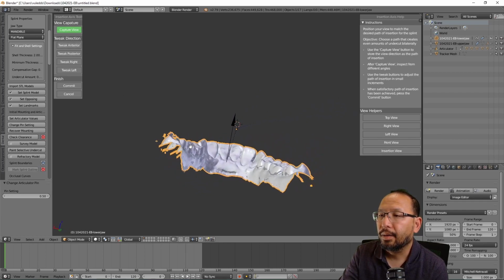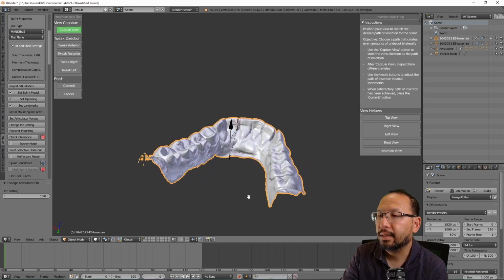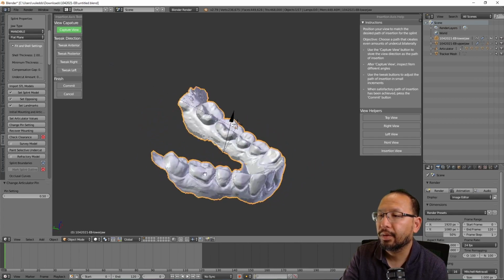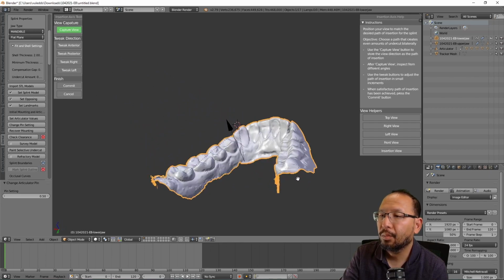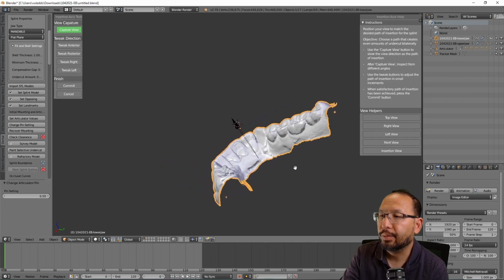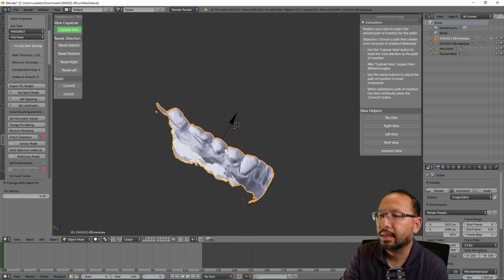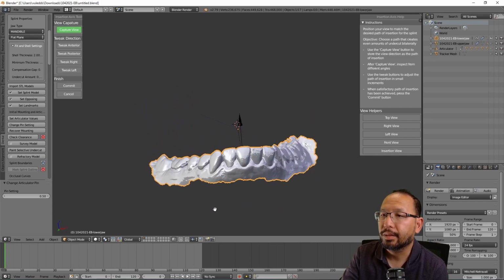On the inside, I always check the linguals on a lower. On an upper, I will check the buccal posteriors. But I'm looking for undercuts. I want to make sure I have undercuts, and I want to make sure they're balanced. This lady does not have a lot of undercuts. This is going to be difficult.